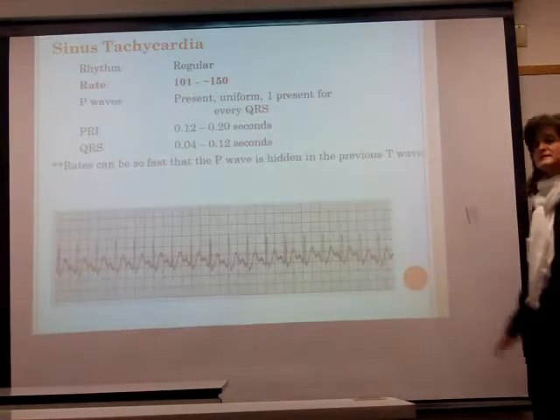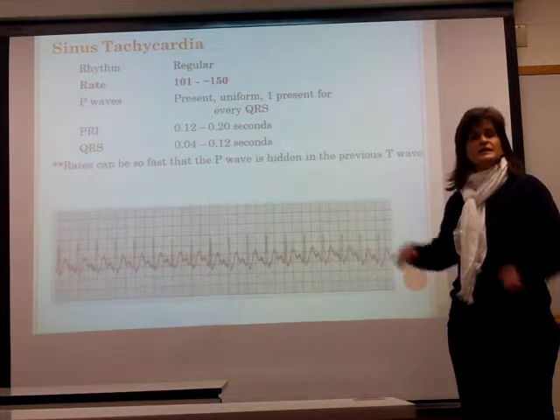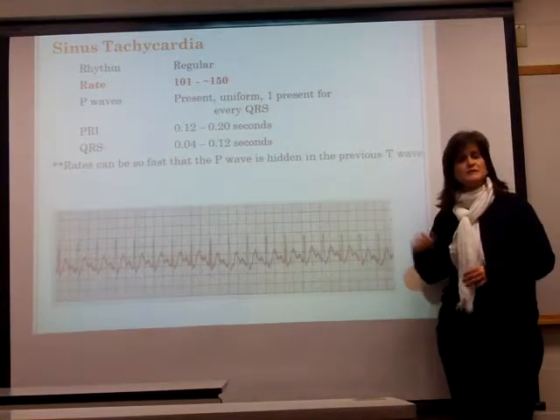Sinus tachycardia is the flip side of that, or the other reverse. The only difference between normal sinus rhythm and sinus tachycardia is the heart rate. Again, with sinus tachycardia, the heart rate's going to be between 101 and approximately 150.